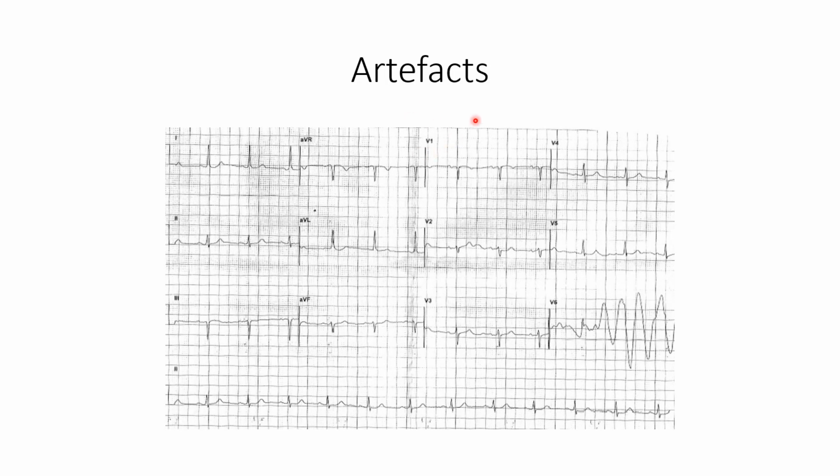Another basic thing about the ECGs is artifacts, right? So down here, that doesn't look very good. That's almost a sine wave, or torsades de pointes. But these ECGs look good, and everyone who's ever looked at a telemetry knows that, well, you need to look at all leads, because the ECG is being taken like that, it's going from, like, this is the same time, this is the same time, this is the same time.